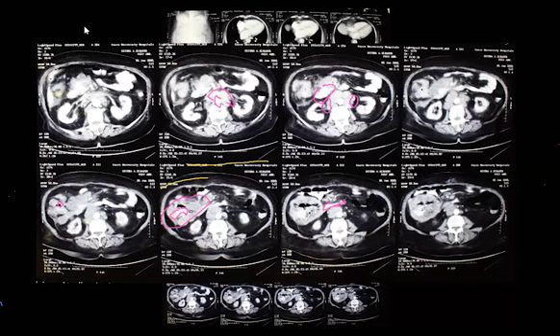A beautiful diagnosis: lymphadenopathy, para-aortic, and a lesion in the colon. How would you confirm the diagnosis of the colonic lesion? Biopsy. Yes, how will you take the biopsy? Colonoscopy.